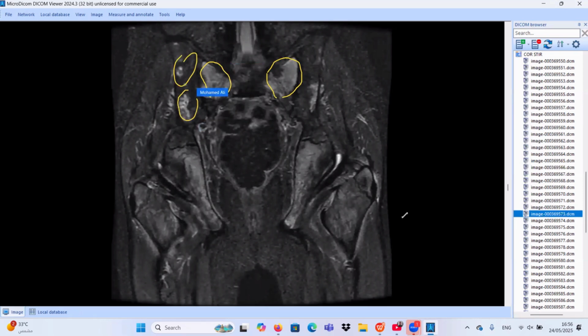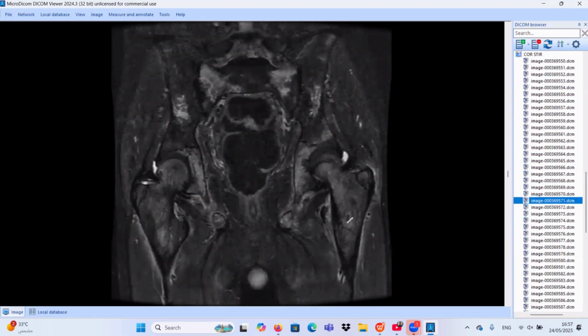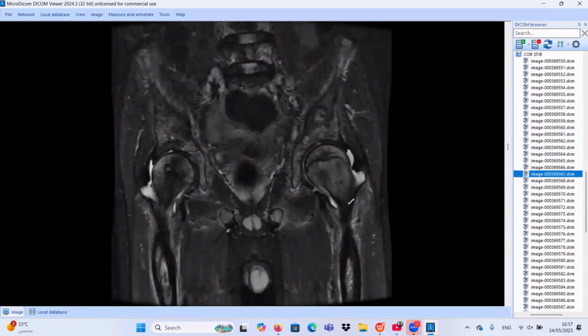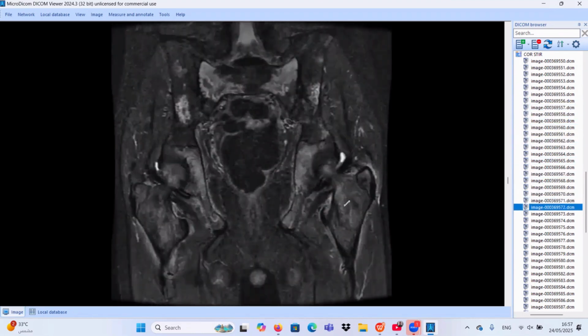Yes, you are right. We have multiple areas of osteonecrosis, and by the way, the intervening low signal intensity of the marrow represents red marrow conversion, or bone marrow conversion. It's very common in this condition. I think we have also bilateral hip joint effusion. So this is a case of sickle cell anemia complicated with subperiosteal hemorrhage. Thank you so much, Doctor. Thank you for your attendance.